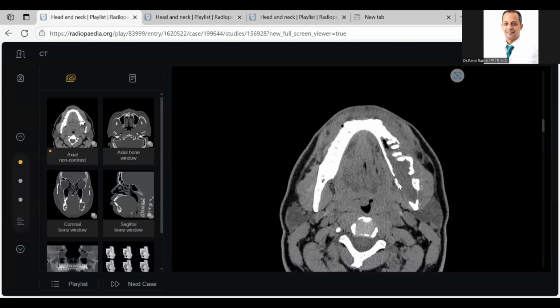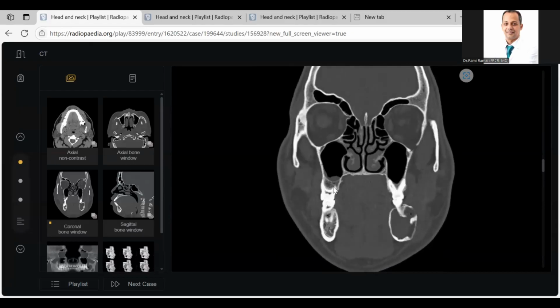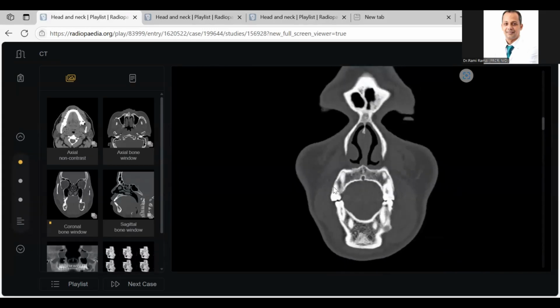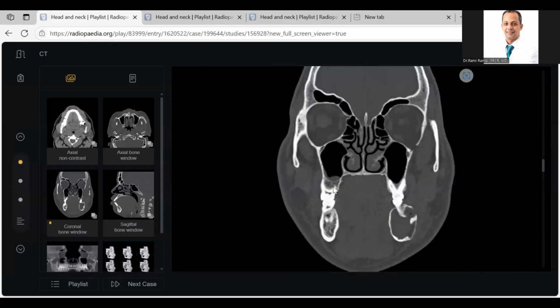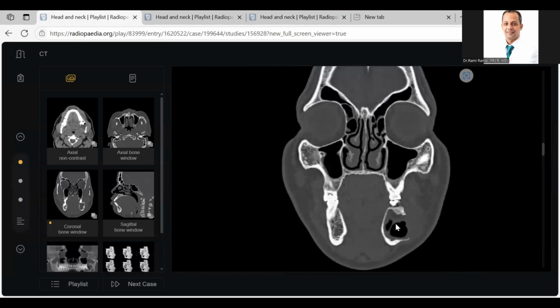Just something lytic here. Try not to regurgitate many illogical differential diagnoses, because the examiner takes an idea from the first words. Look here also, both sides are almost symmetrical except for this little bit of swelling. So this is not inflammation.